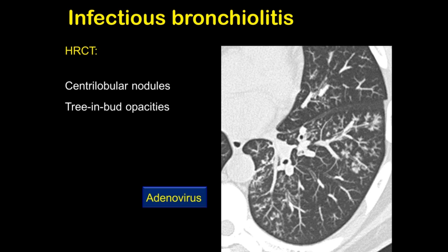Some viruses, such as adenovirus, also may show small centrilobular nodules or tree-in-bud pattern. Usually most of these cases of virus occur in young population, and these patients usually are mainly diagnosed by clinical approach and X-rays.